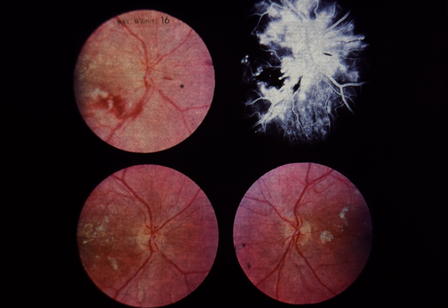Hard exudates are seen in the macula. Superficial hemorrhages and cotton wool spots are seen predominantly along the inferior temporal vein. Upper right. A fluorescein angiogram shows marked leakage on the optic disc and in the peripapillary retina. The patient's blood pressure was 240/160. The patient was initially treated with intravenous antihypertensive therapy and was then maintained on oral agents.